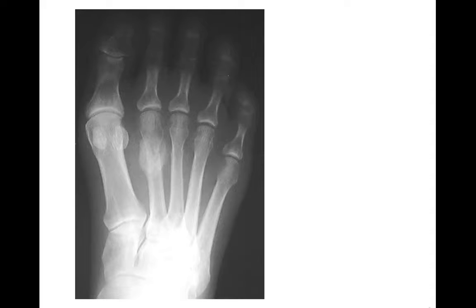Last case, radiograph of the foot, which shows this solid periosteal reaction about the second metatarsal, and you get a sense there's actually this linear lucency through here. This was periosteal reaction in response to a stress fracture. Over time, it's built up this periosteal new bone around it. So a very benign or non-aggressive periosteal reaction in this case. And since we can actually see the lucency through the metatarsal here, saying stress fracture in this case is a very good bet for what this is.